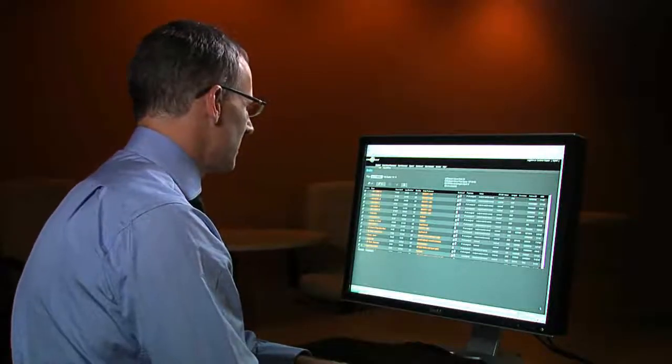I'm Dr. Ian Gardner. I'm the director of the Advanced Breast Imaging Program at the Canada Diagnostic Centre in Vancouver, British Columbia. Today I'd like to share a few breast MRI cases with you and show some of the features of CAD software. Let's start by looking at our desktop.